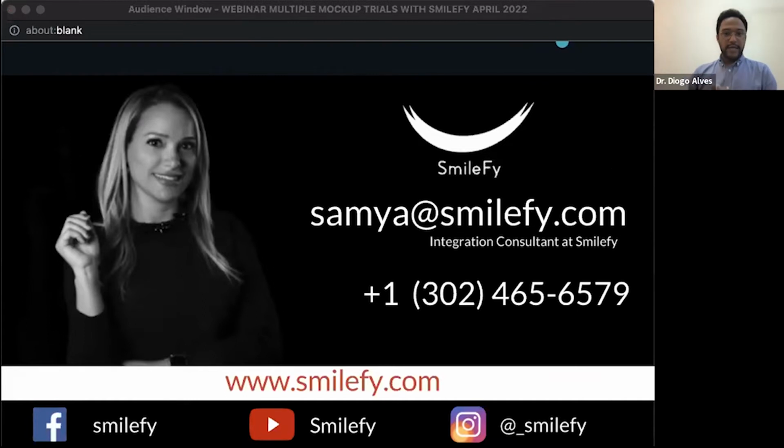The webinar today is based on a software called Smilefy. So for those who haven't tried Smilefy yet or haven't heard of Smilefy, I'm going to show you how you can do a whole workflow using the software with your iPhone, with your iPad, or with your MacBook.